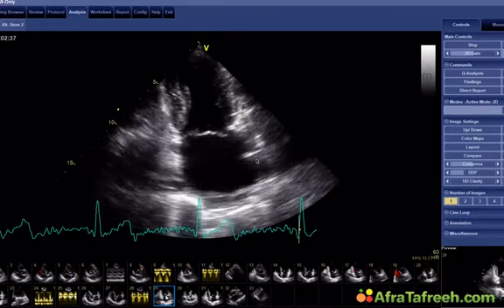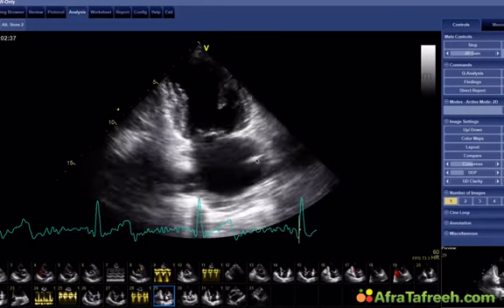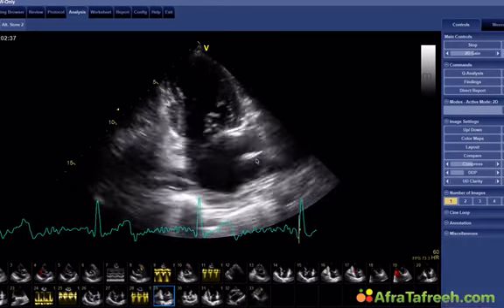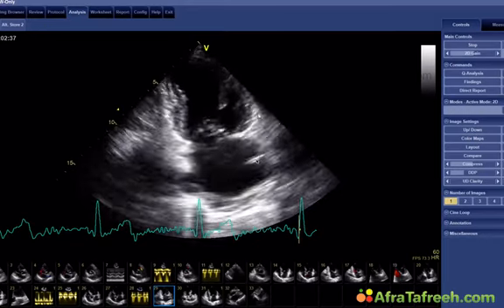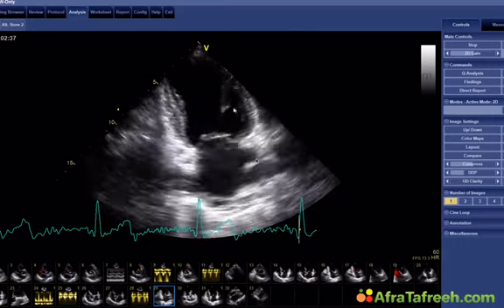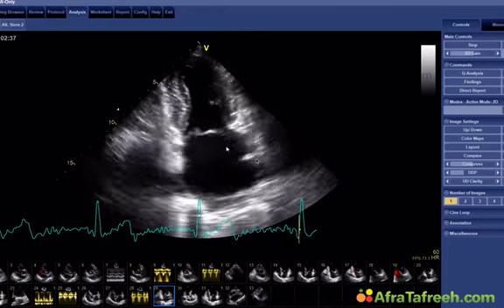What does this mean for the patient? Well, at this point, probably not much, because we're not planning to operate the patient. He is asymptomatic anyway. But if we would operate him, the surgeon would know that this is a problem which is not always so easy to solve, because commissural problems, prolapse or ruptures, are usually much more difficult to operate on.